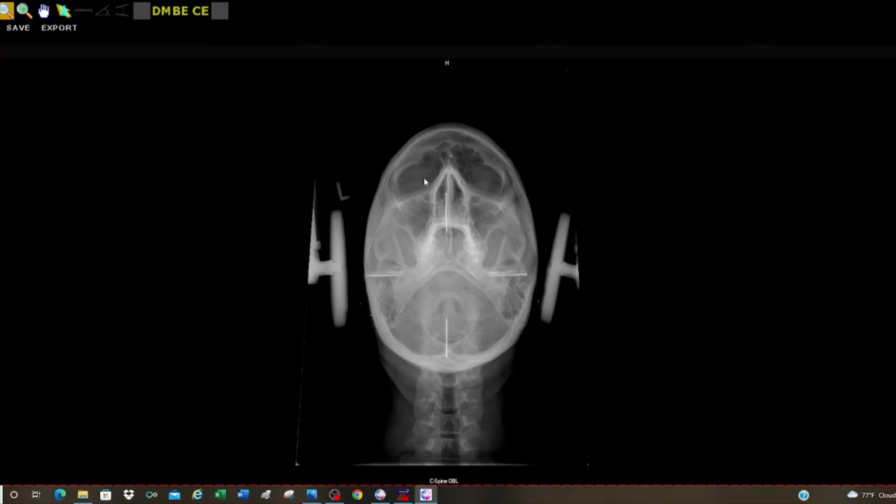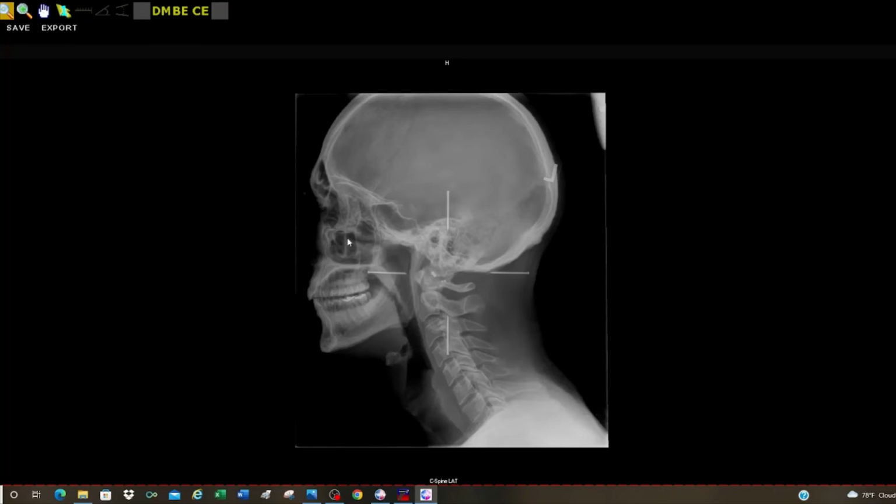all the structure. So again, left side of the film right here, right side on this side. There's your two eyes. The nose is right here. Nose is moving along the center point of the film. These little nails are not in the patient, in case you were wondering. They've been on all of our films. They actually just show us the center line of the x-ray.